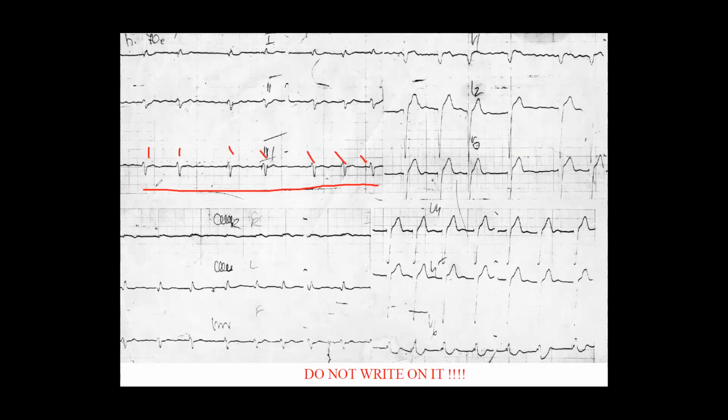The heart rate is difficult, but you can see the 1 second interval, it's a darker line. 1, 2, 3, 4, 5, 6. 1, 2, 3, 4, 5, 6, about 60. It's okay. 60 is normal. Okay. Next one.